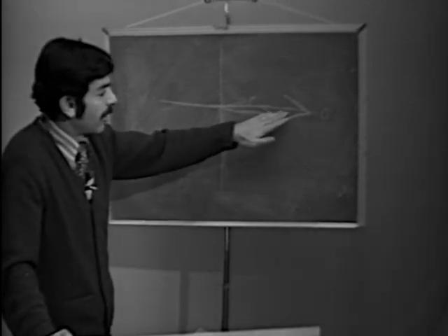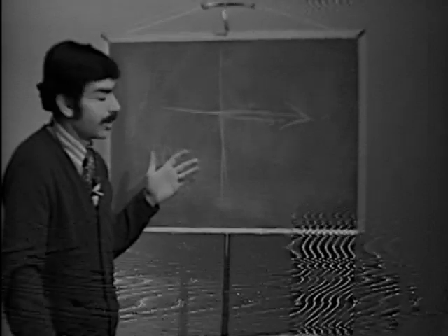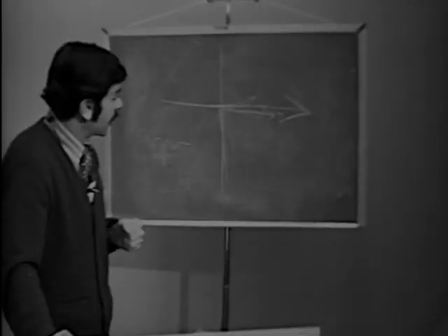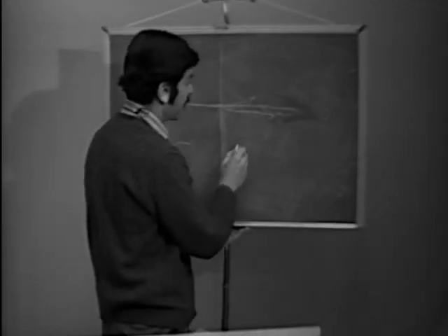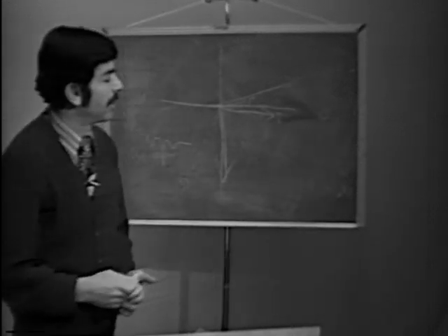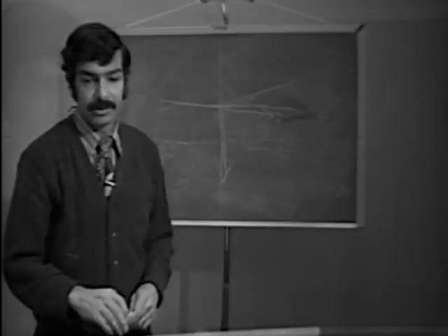When you have a heart with an axis that's going over at 0 degrees, it's all right to have a negative T wave in lead 3. Okay? Remember before we said the T wave should be upright in every lead except for AVR. Okay, the same thing holds when you have an axis which is going in this direction, right? It's all right then to have a negative T wave in lead AVL.